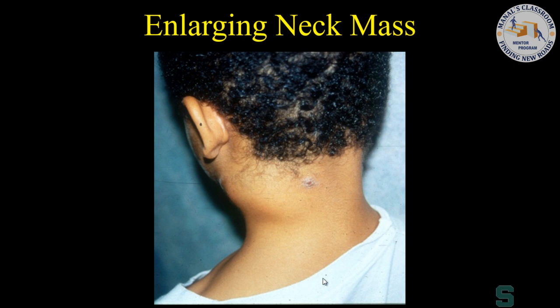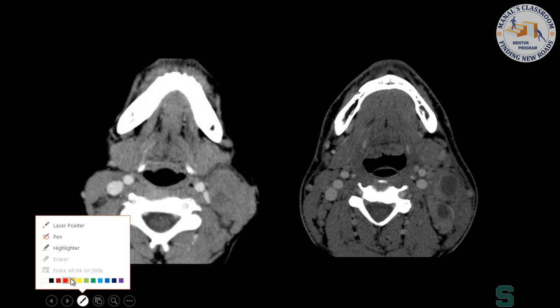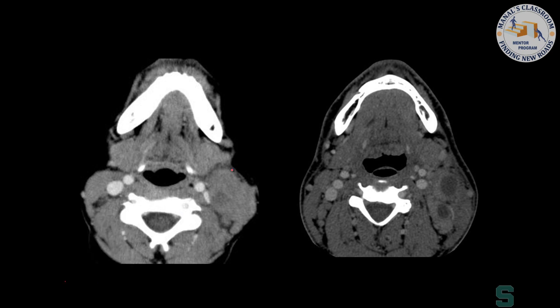All right. So the next thing that we'll talk about now is a mass involving the neck. So everyone's favorite in the middle of the night is a kid that comes in with a neck mass. Everyone loves that, right? It's terrible, right? So the first thing that we have to be aware about is that when we start looking at the pediatric neck and we start looking at lymph nodes, let's go ahead and make our definition of the difference between left and right.